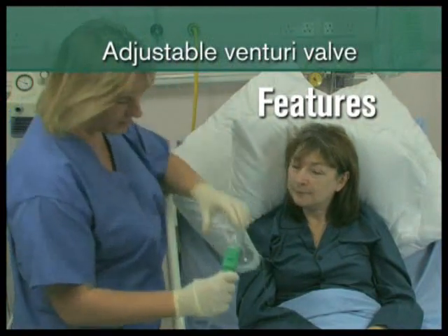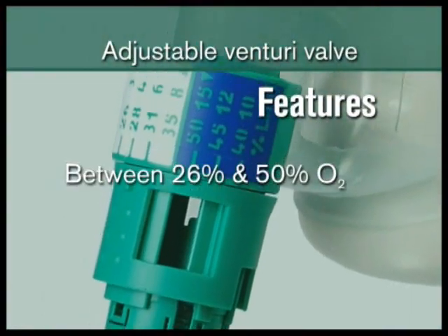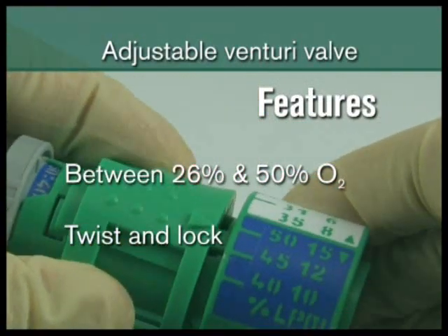The Silente adjustable Venturi can be set to concentrations between 26 and 50%, and incorporates a twist lock mechanism to prevent inadvertent concentration changes.